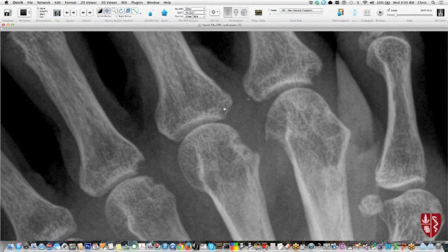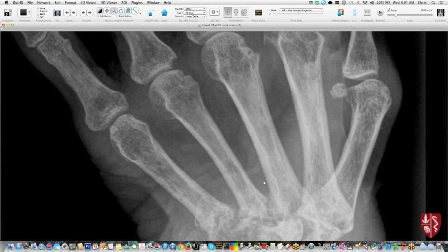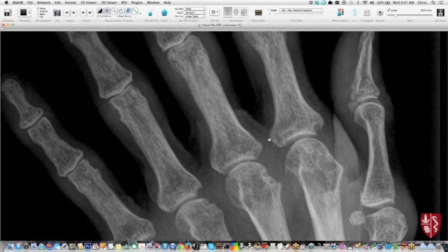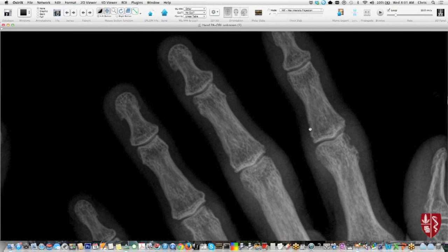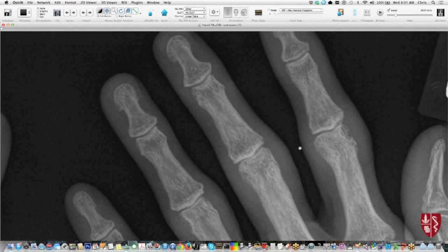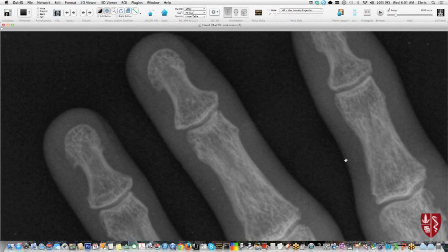inflammatory OA. The other key thing with rheumatoid that we kind of hopefully harp on over and over is that the distribution is such that you get severe carpal involvement and intercarpal involvement and MCP, PIP involvement. Like here's an erosion here in this, but the DIPs are virtually always spared. And so here, if we look at these DIPs, they actually look pretty normal.